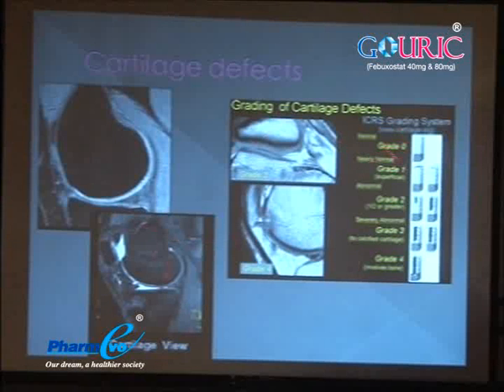And there is grading of cartilage. You will know that better than me. There's grade 1 in which there's superficial, grade 2 in which it's half or greater, 3 when it is almost down to the bone, and grade 4 when the bone is involved. And there is a defect which is going right up to the bone. That's a grade 4 image. And there's another one over here which is a much smaller defect.